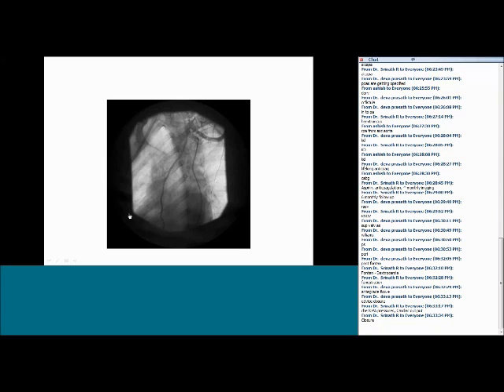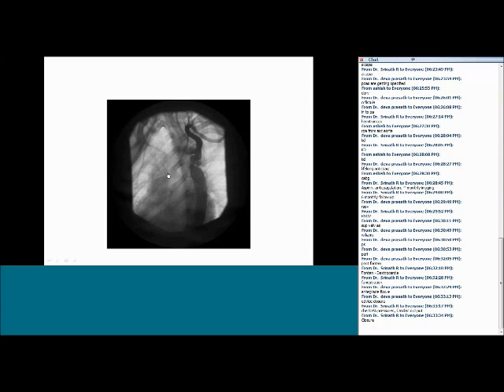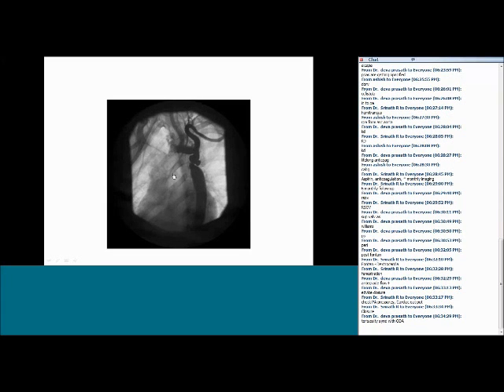Okay, see this angio very carefully and tell me what is the diagnosis, what is the comment on this particular angio. I'll freeze it for you. Okay, right. Okay, what else? Tortuosity with coarctation, yes, but what else?